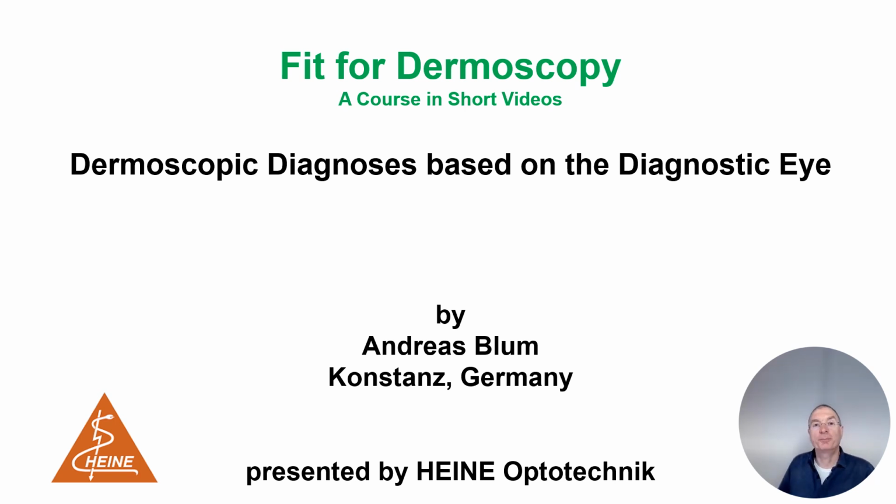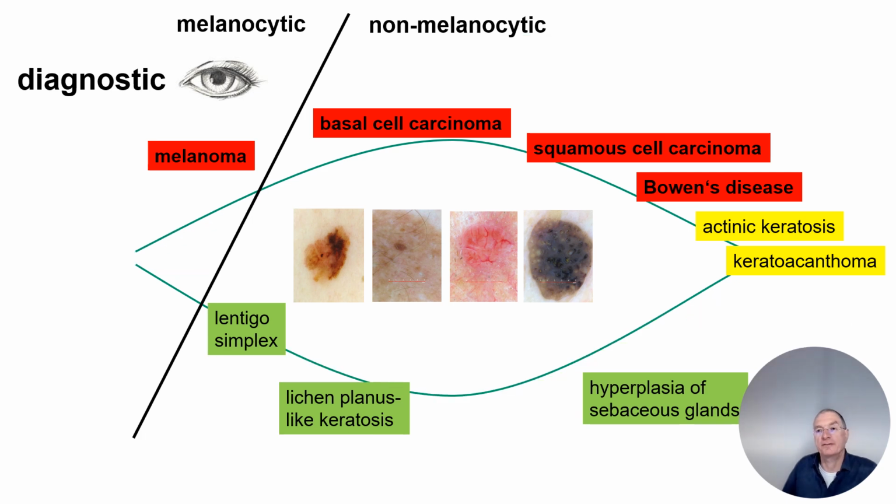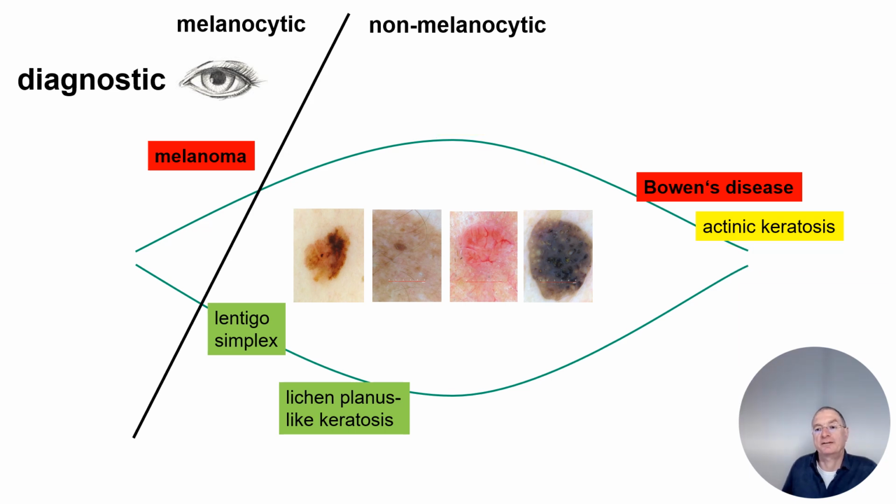Fit for dermoscopy. Welcome to this short video about head and face. From our diagnostic eye, which lesions are we interested in in this area of head and face? These are the most common lesions, and I want to share my knowledge here, which is helpful for me to use in my daily clinical office practice.